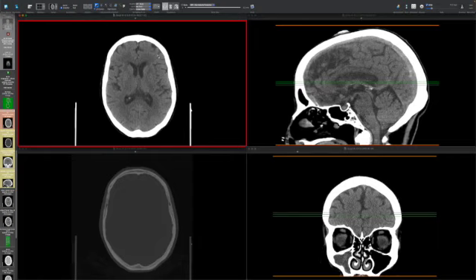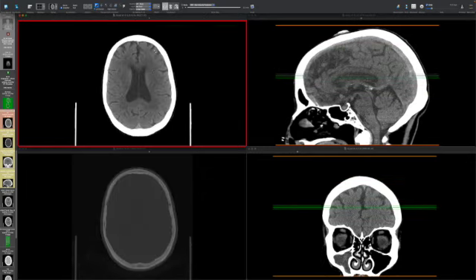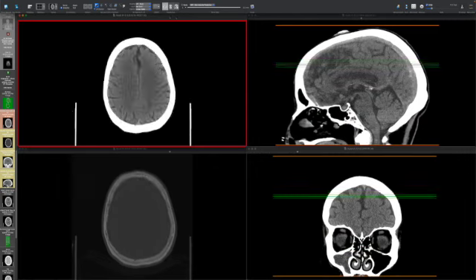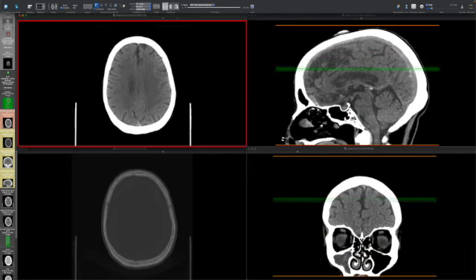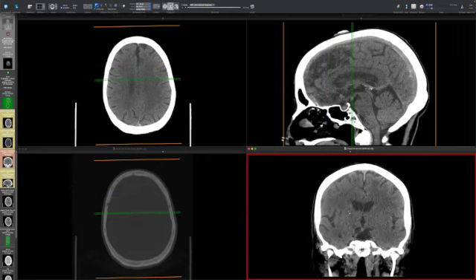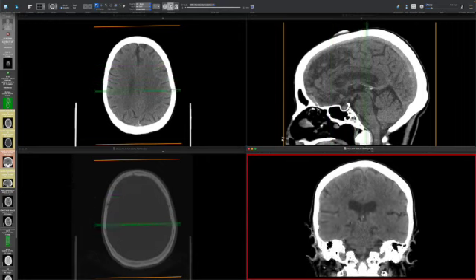One of the things we often look for in the clinical setting of trauma would be hematomas, like a subdural or epidural hematoma, which you'll hear more about in this lecture series. So we look around the convexities for subdural and epidural collections of any kind. The brain parenchyma should really go right out to the skull, and in this patient with normal brain volume, it does.